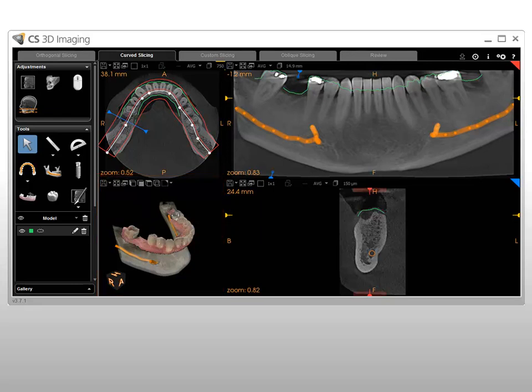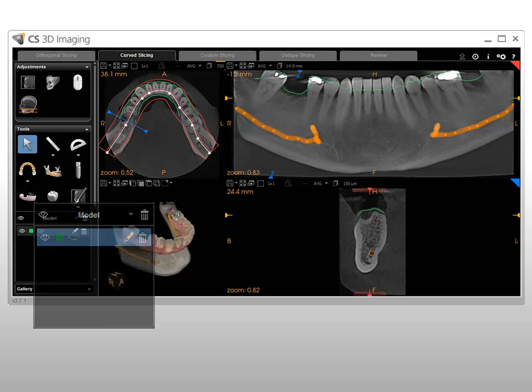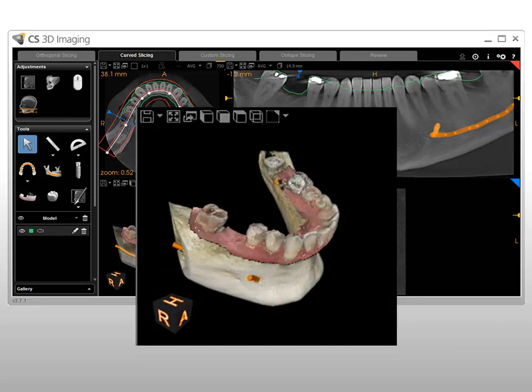The outline of where the model's soft tissue meets the slice panes is displayed as a green line in the following view screens: Axial Slice View Screen, Reconstructed Panoramic View Screen, and Oblique Coronal Cross-Section View Screen. The model appears in the Object Management panel. Check that the alignment has been performed correctly by comparing the patient's teeth with the model.